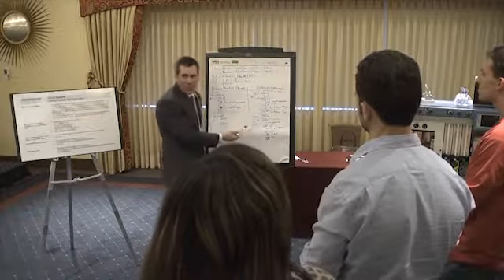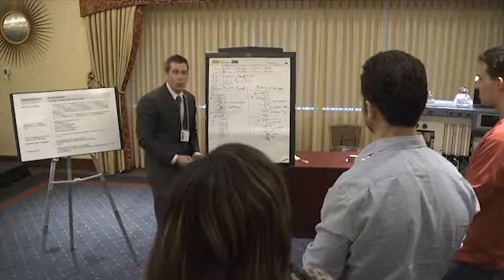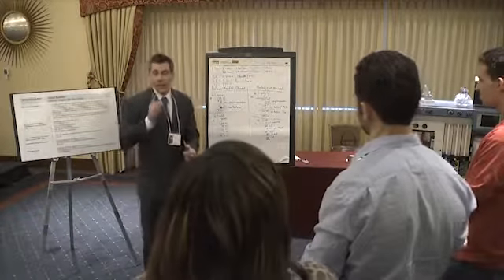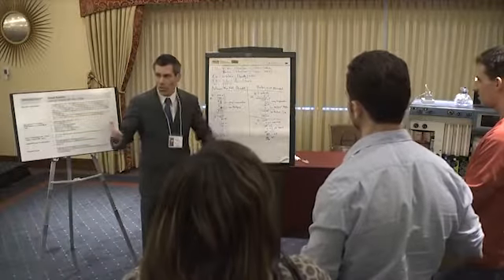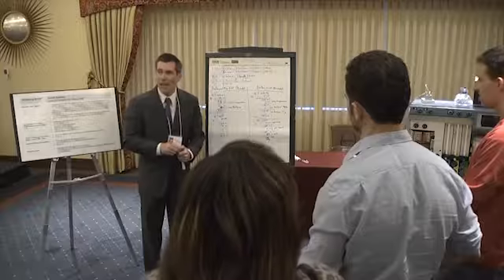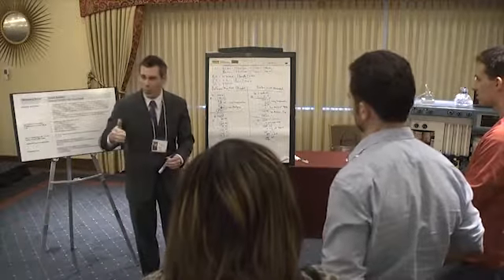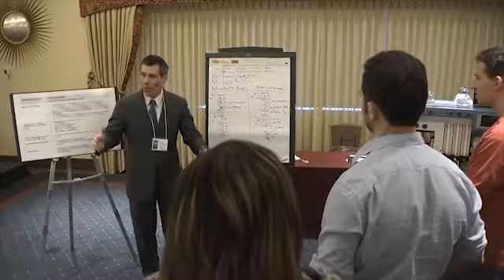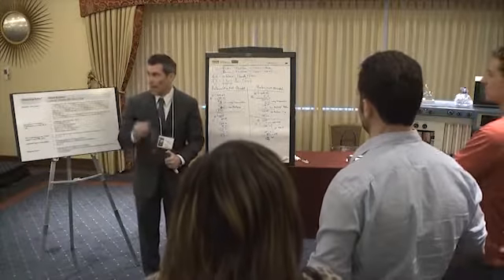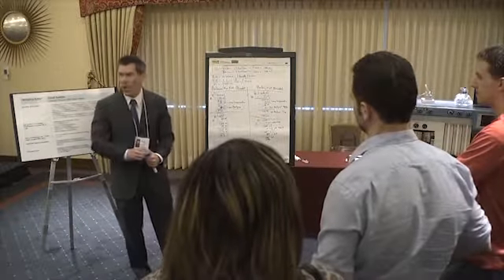It looks like I work for Draeger here. It says all zeros. Compliance compensation. If you do the machine leak test, the compliance compensation leak test, so you stretch out the circuit, you plug it up, you hit leak test, it's going to account for that. When that is most significant is when you go from a pediatric to an adult to pediatric, because you have a wider range in the compliance of those circuits. Pediatric circuits are made much smaller, so there is less compensation required for it.